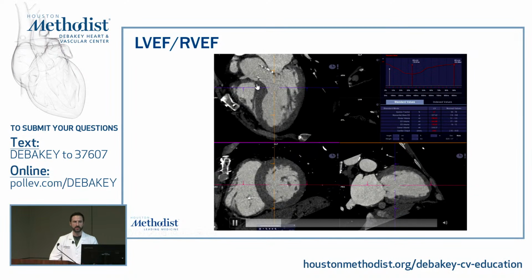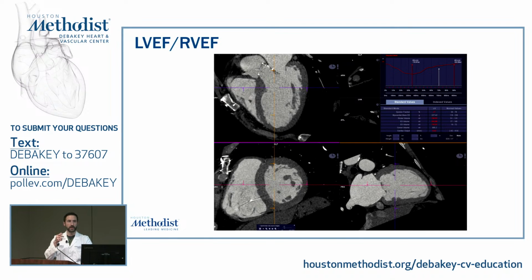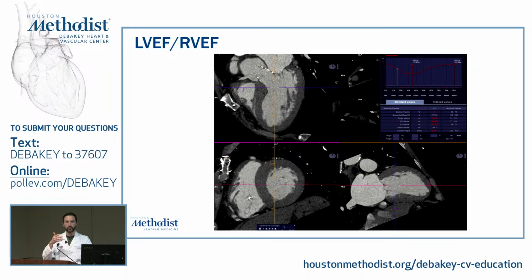Yeah, I'm not aware of that literature, to be honest with you, but when we do these retrospective gated measurements, remember a septum is somewhere here, so we can do all sorts of reconstructions to get to that septum. If there's a VSD, you'll see left to right shunt with contrast. We've commonly diagnosed ASDs and PFOs based on that left to right shunt of contrast. But I'm not aware of any specific measurements that we commonly do just for that septum.